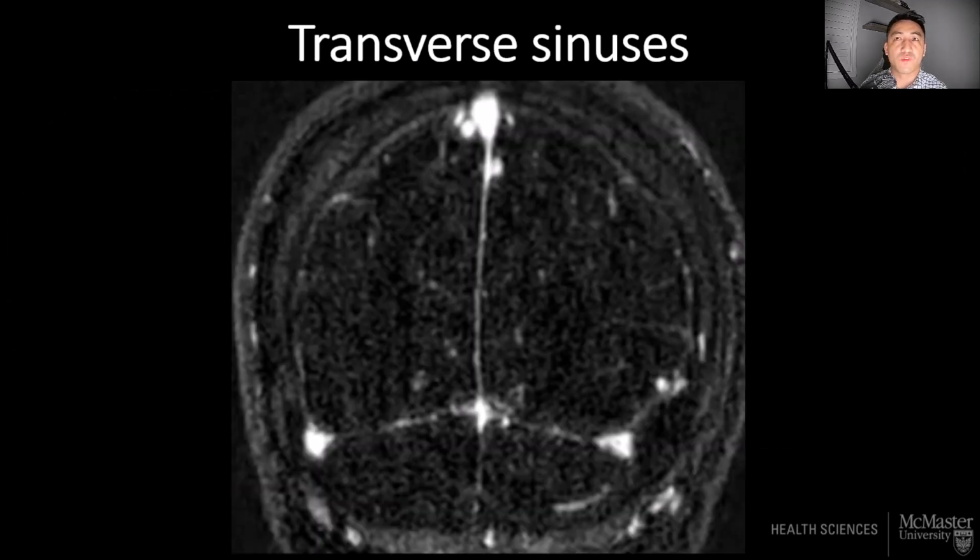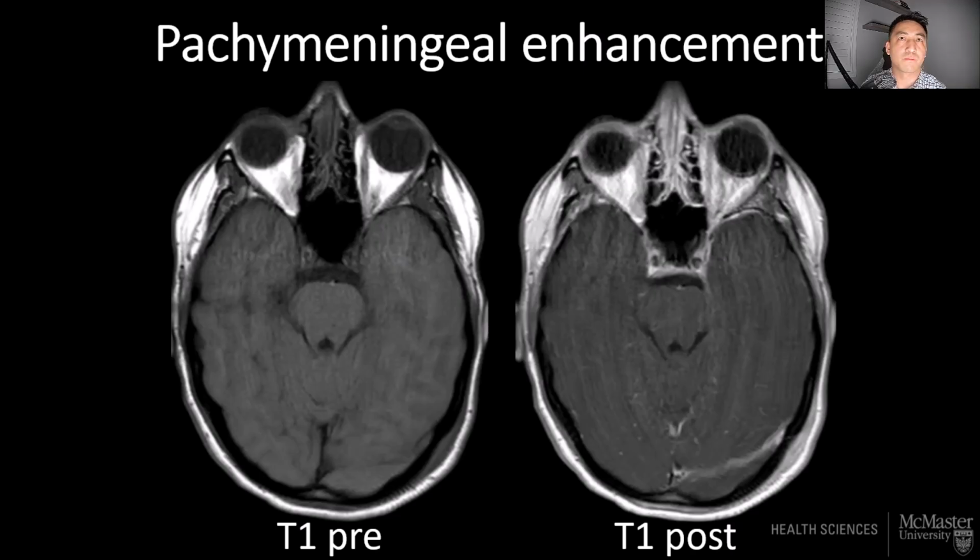We may want to rule out venous injury if there is a venous epidural, especially if there's an overlying fracture. This case is negative. I think a CT venogram would have been better, being mindful of our MR time. There's also no need for post-gad sequence. If it's done though, you should see smooth pachymeningeal enhancement adjacent to the hematoma.